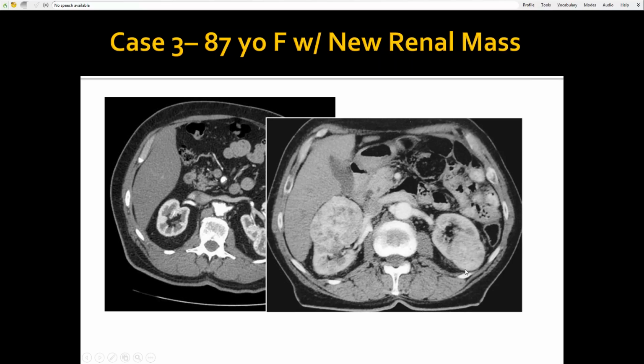This tumor over here, you could potentially treat. One thing I've done is actually gone in and embolized this tumor that's fairly big with ethanol into the artery itself, and then go back and actually do a chemoembolization, or a thermal ablation, like a cryoablation. So it shrinks the tumor to get it into a decent size and then go back and treat. This tumor is pretty much too big, so your best option would probably be, again, to just embolize this segment of the kidney, and maybe the surgeon would take it out.